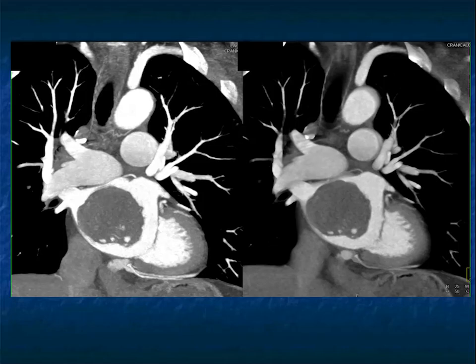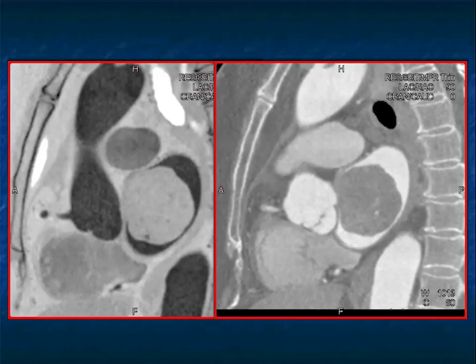If you think about a differential diagnosis, you can have metastasis to the left atrium, but usually it's something that will extend along the vessels, not an intraluminal mass like this. And the smooth nature of the lesion really does push you to the right diagnosis of atrial myxoma.